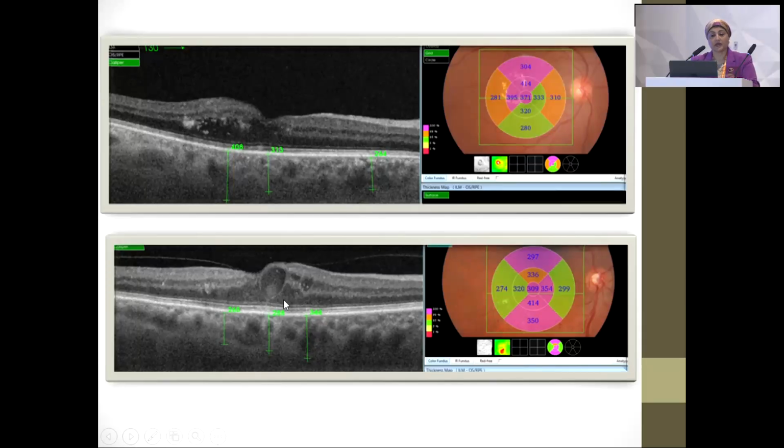This is a comparative study in macular edema of the thickness of the macular area compared to the choroidal thickness. And of course, there is marked improvement with anti-VEGF in cases with thickened choroid. This means the vitality of the structures, especially the outer retinal layer. And in both of these photos, we can see the integrity of the outer retinal layer, external limiting membrane, and the Bruch's membrane, RPE, they are intact, so it carries a better prognosis, though the thickness of the macular area is about 450 microns.